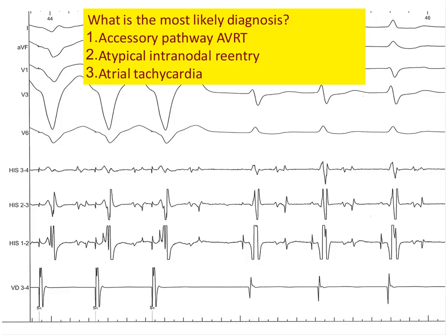And Fernando, I'm afraid that this is going to be just a very fast comment. This is a very useful maneuver, not for the previous case where the diagnosis was evident, typical reentry tachycardia, but for this case where we have the typical long RP interval. So these cases can be really challenging in the EP lab, and this maneuver is especially useful. So this is a good case. Yeah, and also this is a simple maneuver. I want to stress that for the maneuvers we are commenting on now, simplicity is important.